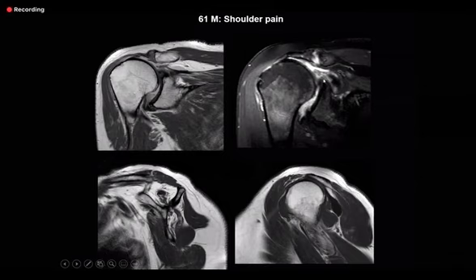In your clinical practice, actually you measure it also, but not in the exam. We measure it in two sequences, one is coronal oblique and then sagittal, and we measure it like this from here to here, and then from here to here, and tell the surgeons that mediolateral is this much and AP is this much, full thickness tear. Retraction of the musculotendinous junction is very important. As you have pointed out, atrophy of the muscle is very important. They might not like to do anything about this case, surgically speaking.